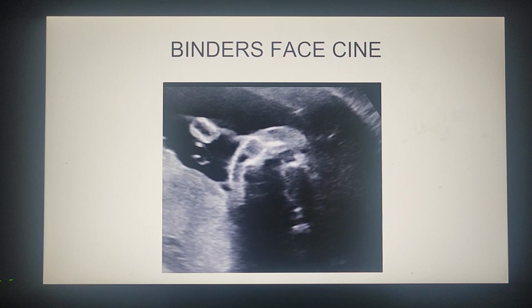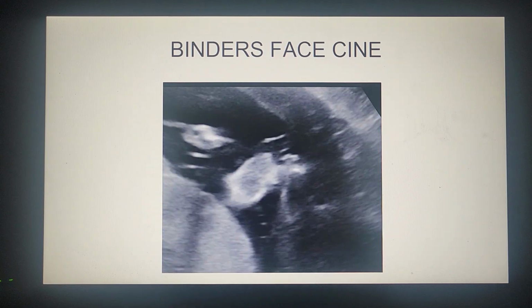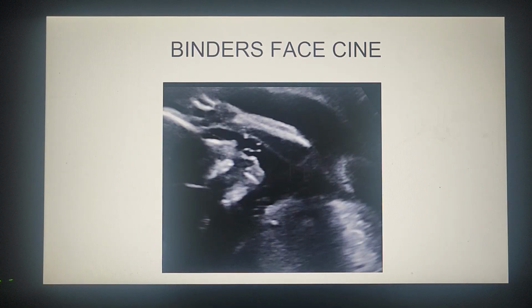That's the axial view showing a broad nose, widely spaced out nostrils, and that's the flat face in profile.